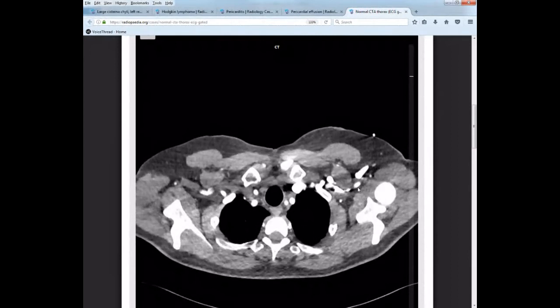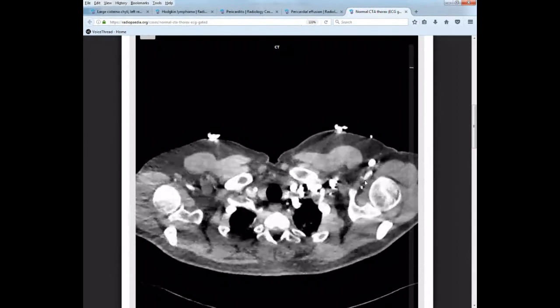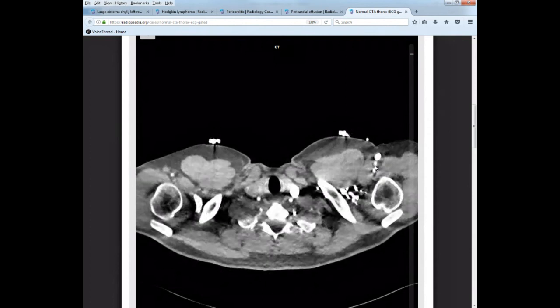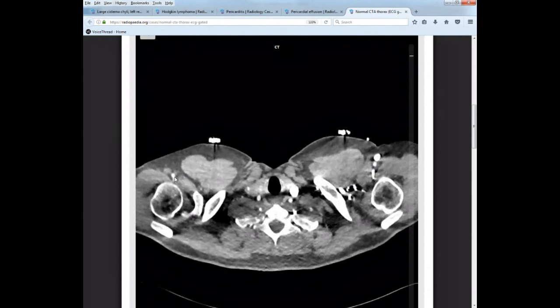And you can see how this is the vein and this is the artery traveling over. Okay, vein, artery. See how the venous flow here is much brighter than the arterial flow, and that's because we haven't quite opacified the artery as much, and the contrast is coming directly from this extremity. When we look over in the opposite extremity, see how my vein, my right subclavian vein traveling down is not as bright. There's no contrast there because we haven't gotten to venous flow yet, but my artery is opacified.